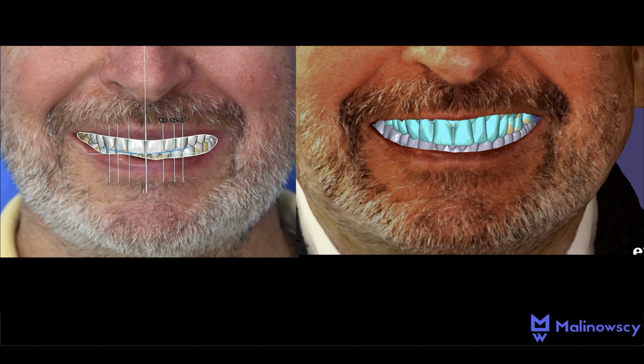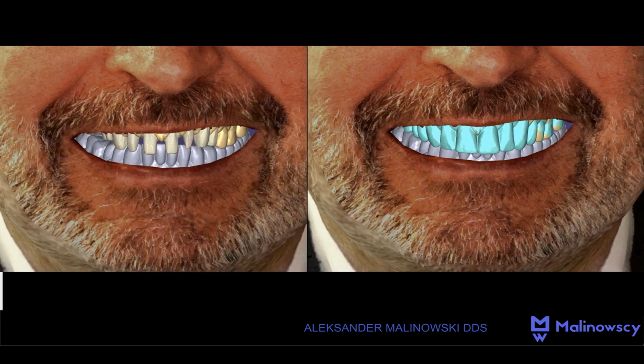Okay. This slide showcases the digital smile design process undertaken at that time. The project on the right has been tailored to meet specific aesthetic requirements. The decision to give the teeth, which tend to be elongated and narrowed by the periodontal treatment, a square shape, aims to optically widen them. The design also includes an adjustment by slightly elongating the dentition on the left side compared to the right side to ensure symmetry along the midline.